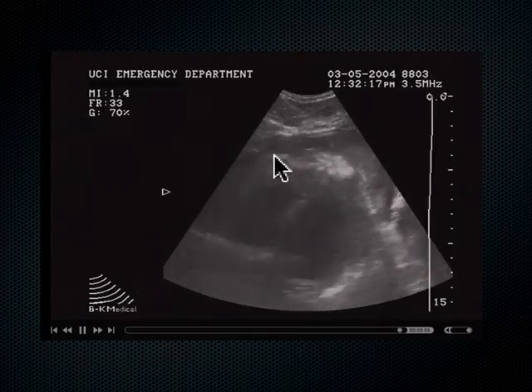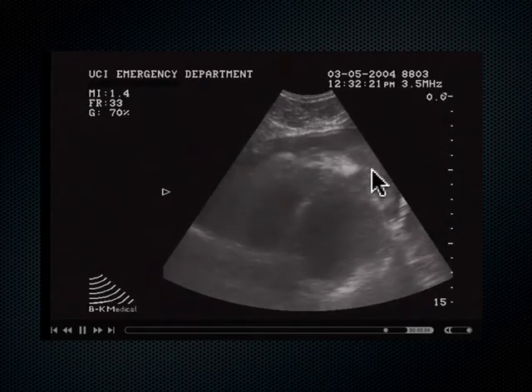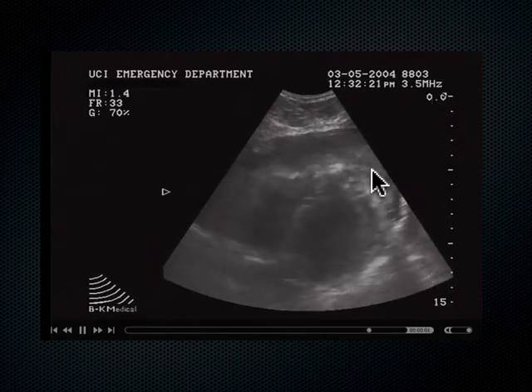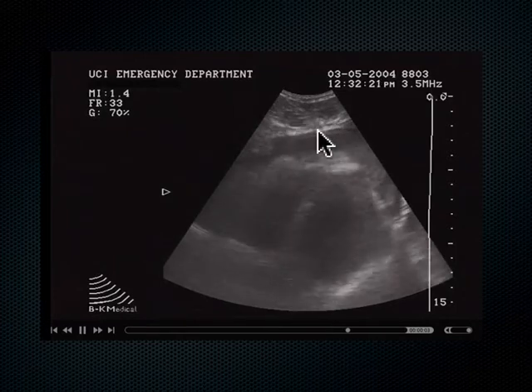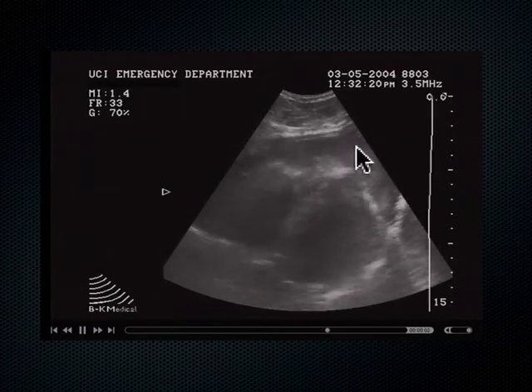The question is, what is in here? Is it fat or is it clot? I mentioned briefly that fat is usually no greater than 1 centimeter in thickness. These are centimeter hash marks. Is the distance between the myocardium and the pericardium more than 1 centimeter? Absolutely. So right off the bat, I'm very curious. Is this isoechoic or heterogenic?